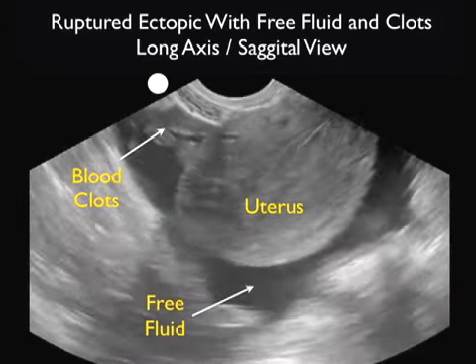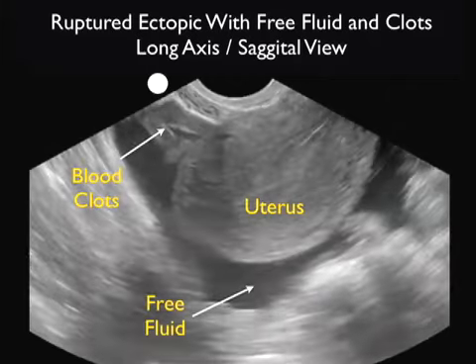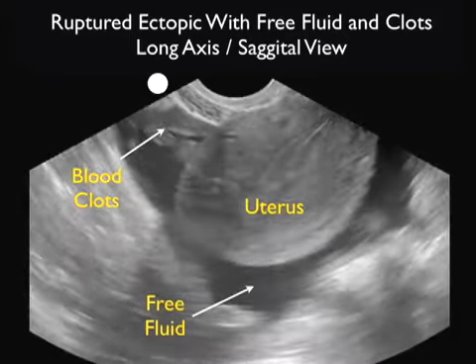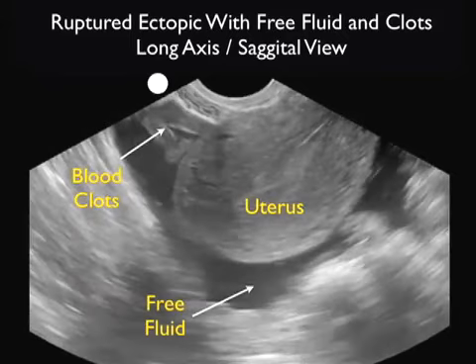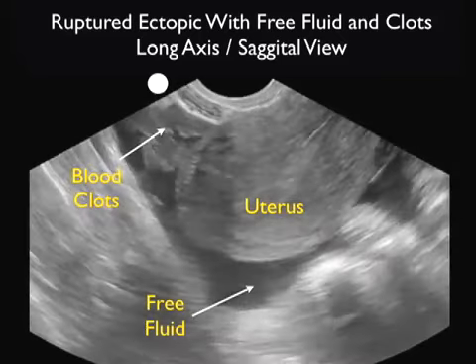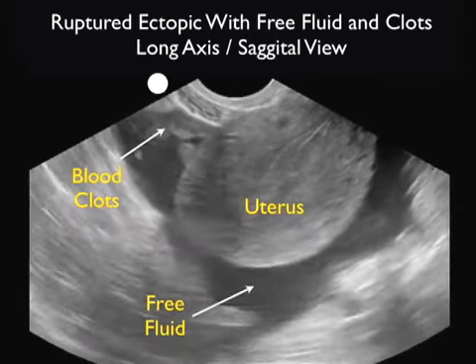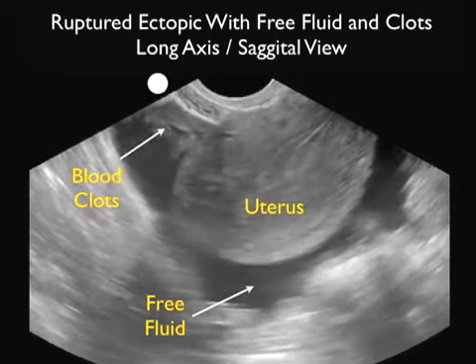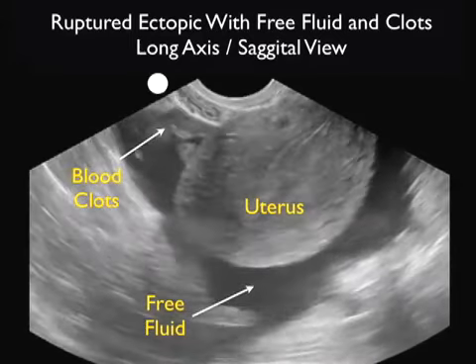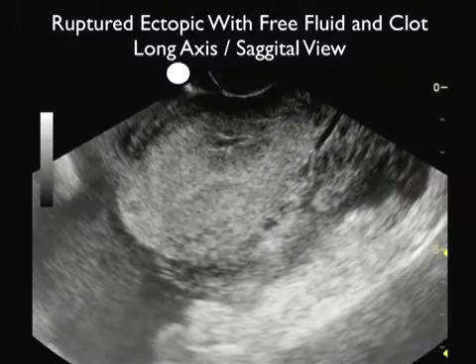But what we see here is a large amount of free fluid, that dark or anechoic fluid, posterior to the uterus in the pelvic cul-de-sac and coming around the uterus anteriorly. Notice the presence of echogenic blood clots also seen anterior to the uterus. These findings of no intrauterine pregnancy with a large amount of free fluid are very suspicious for ectopic pregnancy. Here's another case.